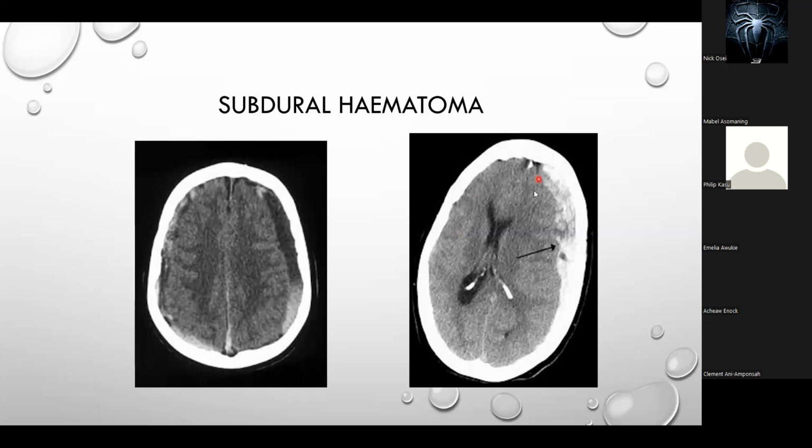All right, so that's about it. So there's a pressure effect here. It causes the ventricles to compress. So with this pressure effect, if you don't have surgery for this person, you die within a few hours. Okay. So that is what I'm saying.